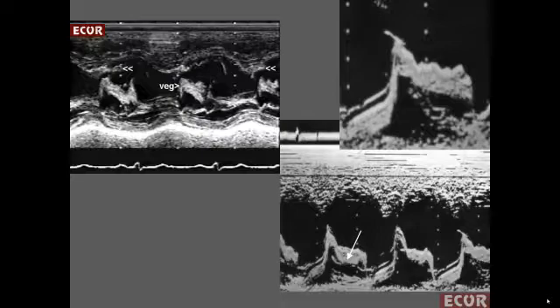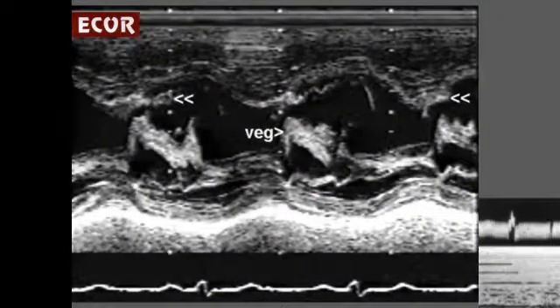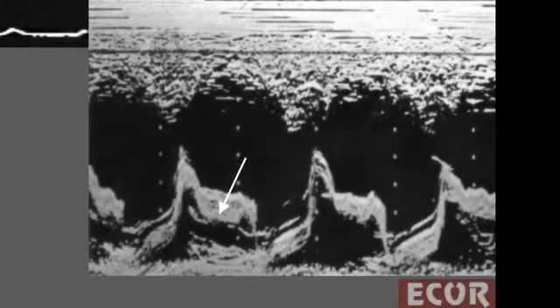Here is an example: infective endocarditis in the mitral valve and in the septal wall, probably in a false tendon. Look at the characteristic findings here at the valve. Notice that there are no lines here or in there. Instead of lines, there is a smudge. Look at this aspect, like a cotton or a cloud. You see no lines. Look at the torn paper border. This is a classical aspect on M-mode.